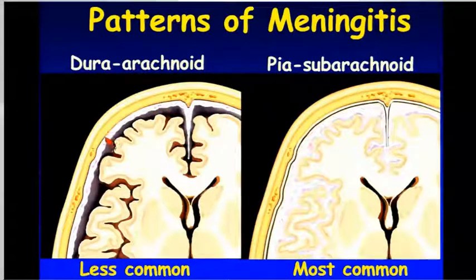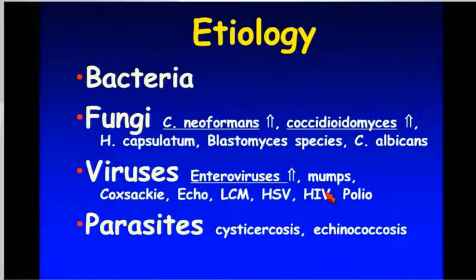Now, dural enhancement, which follows the inner table of the skull, can be seen with some infections, particularly viral, can be seen as a later complication, and in children, especially with things like H-flu meningitis, you may see more dural pattern. But for the most part, the dural pattern is nonspecific, whereas the pial subarachnoid pattern is one that's highly suspicious for meningitis: blood, pus or cells, as we say, so that's going to be your differential: subarachnoid hemorrhage, infection, or some other cells like neoplastic conditions.